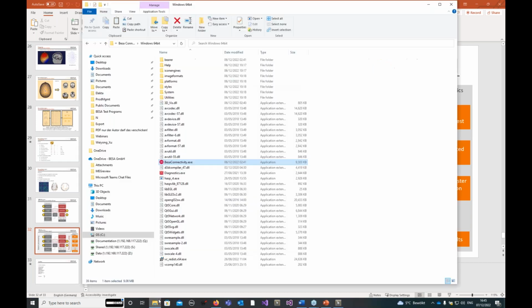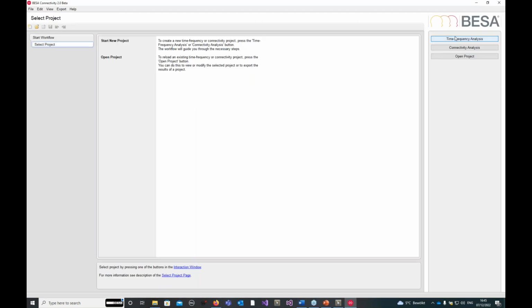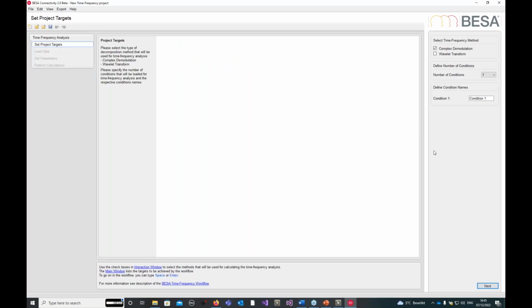This will again require me to start this program. And now I'm going to do a time frequency analysis on a number of subjects.